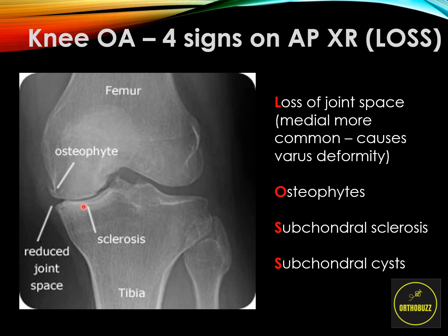What happens in the pathology of osteoarthritis, which is a wear and tear pathology, is that once the articular cartilage has been worn away, we have bone rubbing on bone, and this can cause fissuring or cracking of the articular bone. This therefore allows fluid from the synovial space to propagate into the bone and can form little cysts just underneath the joint line, which can be seen as darker circles or patches. In this case, it's difficult to see any cysts, but there may be small ones visible.